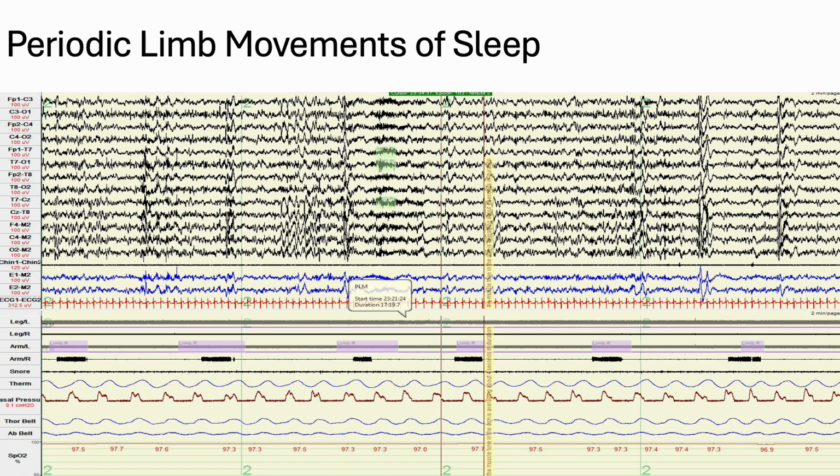Here's something you don't see every night. I think this is the only study I've ever run that had periodic limb movements that weren't legs. These were arm movements. Check this out. I've got the legs right here. They're not doing anything. But I've also got arm movements, and sometimes those are used in parasomnia montages. These electrodes are situated on the forearms, and those muscles activate the fingers. So this patient is most likely flexing their fingers into a stretch or a fist.